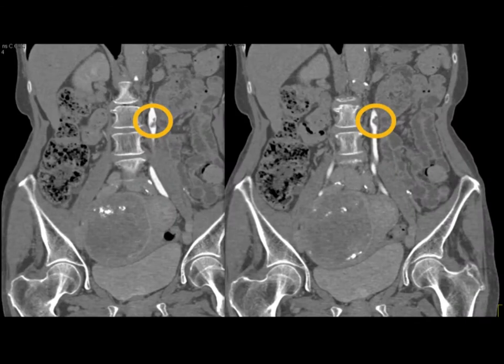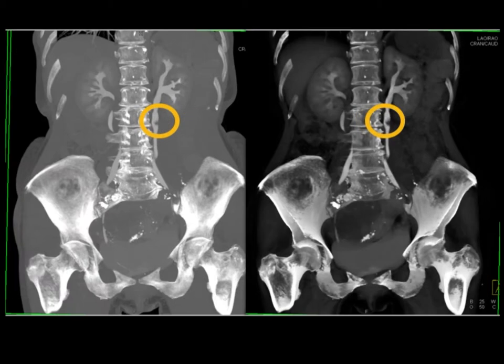In this case, the ureter is a little bit dilated, but that's because of the pelvic mass, which was uterine fibroids. But look at that subtle lesion in the patient's ureter. And again, it's obvious with the right windows, with the right reconstructions, but you can see how easy it is to miss. So hopefully I've made some good points about the ureter.